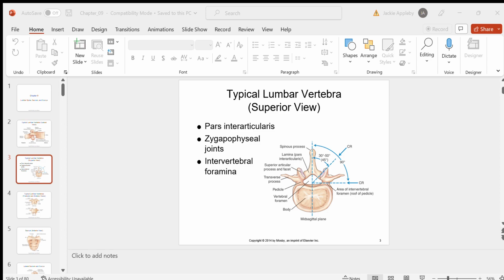And what's most important to take away from this image, you're going to have to be able to label anatomy, okay? The state puts some emphasis on labeling anatomy. Remember they put like a medium emphasis on labeling anatomy. But so you're going to have to understand, when they point here, what is this? Well, it's the pedicle, right? So you're going to have to be able to label the anatomy. But first off, we need to get on the table, what angles do different structures sit at?